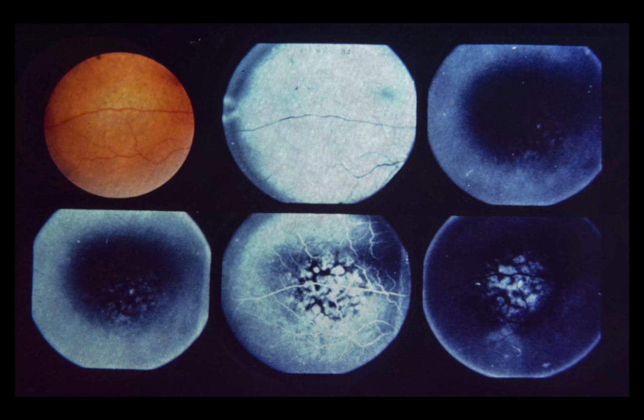Slide 84, choroidal hemangioma. This 42-year-old white male noted blurred vision in the right eye. Visual acuity was 20/20 OU. The left eye was entirely normal. The right eye had a choroidal thickening inferotemporal to the disc, 4 disc diameters in size, with about 1.5 millimeters elevation. Subretinal fluid was visible at the margins of the lesion.